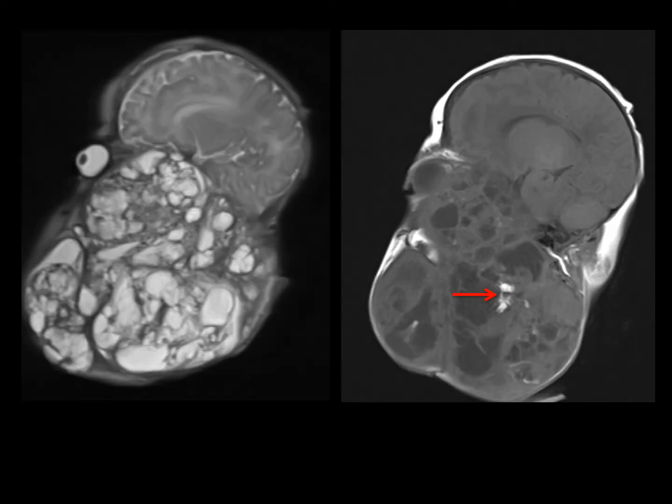And look, when we are dealing with tumor. This is a neonate with a large tumor that has two characteristics. T2 with STIR delineates the multicystic appearance of this tumor. So this tumor has a lot of cysts full of water. We do not have a signal of the fat, because this is a STIR sequence, so we clearly delineate the margin of the lesion.